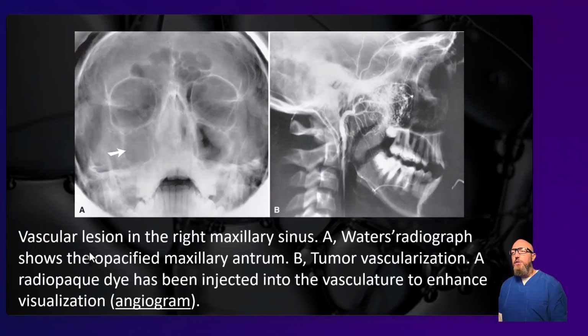And one last interesting finding here. If you remember back to first year and I talked about different extraoral views, we used to do more of these Waters views where you would tilt the patient up and that would get a good look into the sinuses. You can see there's just some mucosal thickening in the left one, which is not terribly uncommon, but the right sinus looks completely opacified. Now that could be just sinus disease. Sinusitis causes fluid buildup in the sinus.